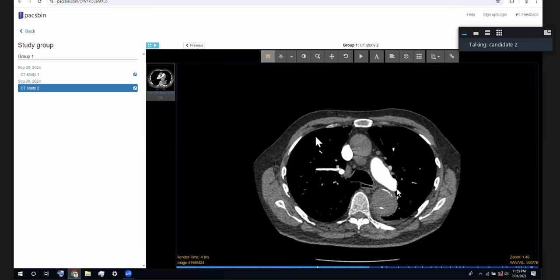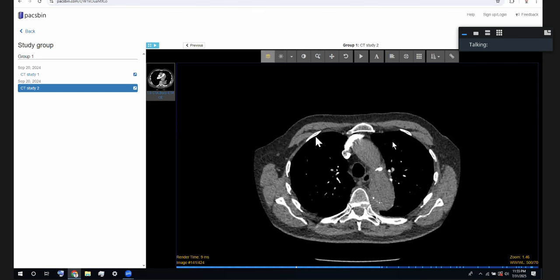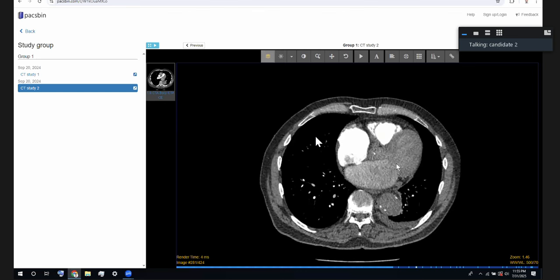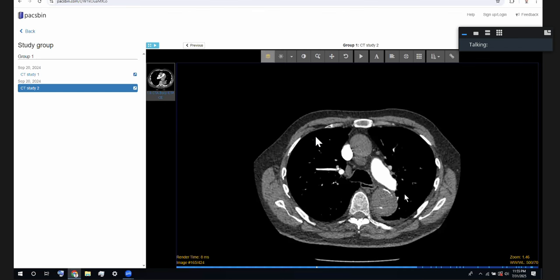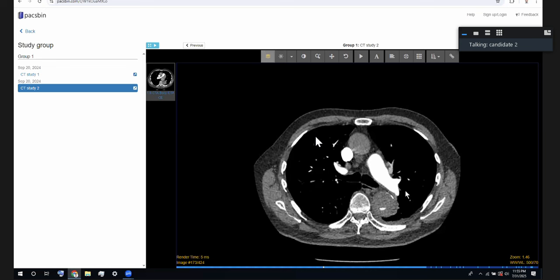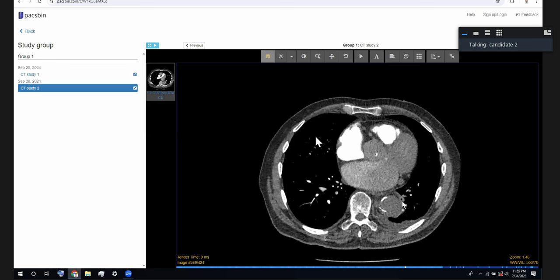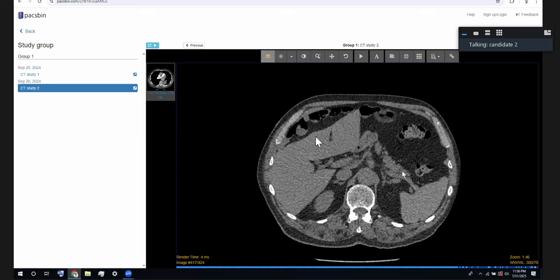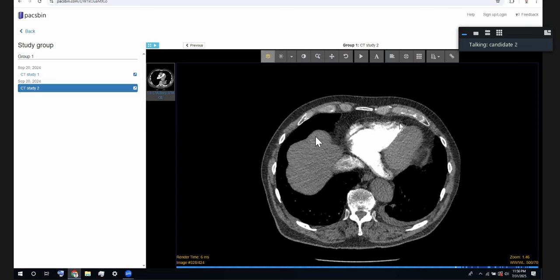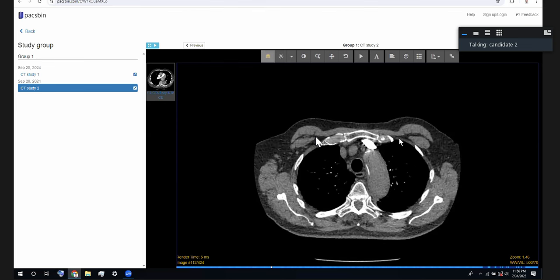So I can see the aorta is enlarged, dilated. I can see there are intimal calcifications which are medially displaced. And there is some thickening in the mural aspect, which I'll be seeing in the contrast series. I'm just completing the entire stack of images. So the abnormality lies in the thoracic aorta, with dilatation and medialization of the intimal atheromatous calcifications.